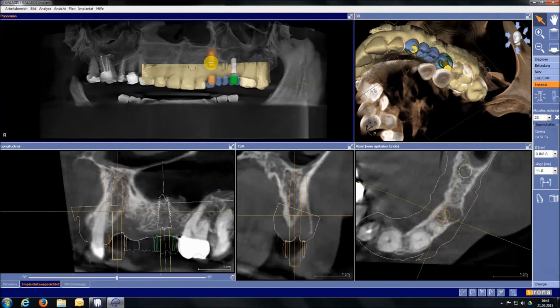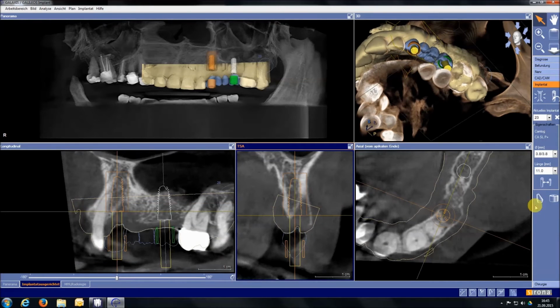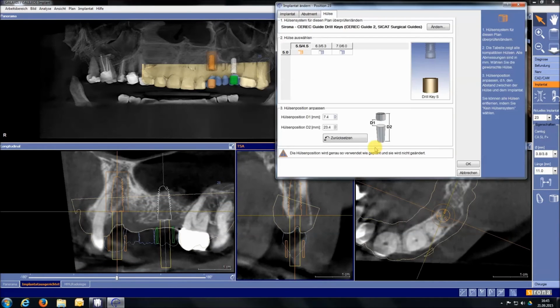In this case, implant 2-3 is relatively high. For this reason, the implant should be moved down slightly. This is doubly true bearing in mind that bone augmentation may be necessary in this area. Accordingly, the sleeve should be corrected again should it still be too high.